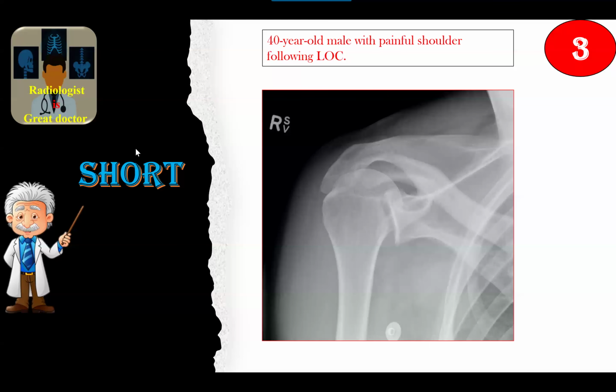Anterior or posterior dislocation? Sir, posterior, because it's directed towards the scapula, acromion, not the chest wall, not the coracoid. Very good. And this sign is named? Sir, I have no idea. You need to revise, boss. Trough sign. Lucent line and the sclerotic line.